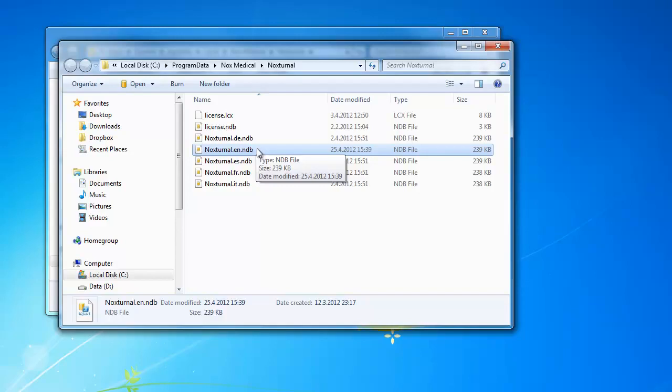It's very important that you copy the global settings into the local settings, because we don't write anything into the global settings. We always modify the local settings. So it's very important that you copy the global settings into the local settings, make your modifications after you've done that, and then move the database or file back to the global location.